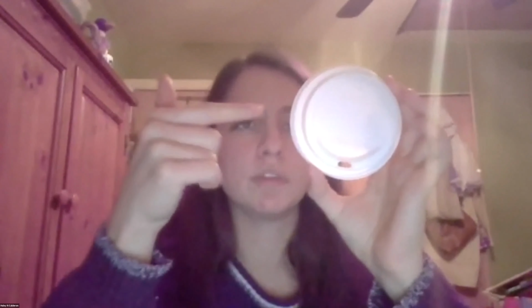Hold on, there's a purpose to this. Referencing is like, if this is the top of your head and you have EEG channels everywhere, say you want your reference channel to be the one that's right here, right? Re-referencing is just saying, well, now I want it to be this one.